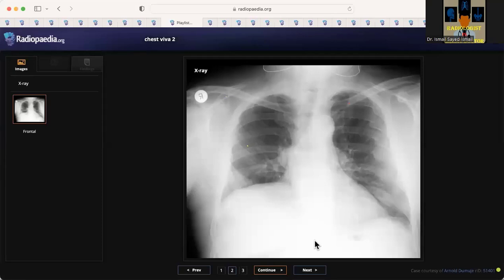So looking again at the lungs and my review areas, I'm looking at the lung apices, the retrocardiac region, and the infradiaphragmatic regions. I don't see any obvious abnormality. I'm looking at the hilum. Maybe there is some fullness on the left hilum with left hilar opacity.